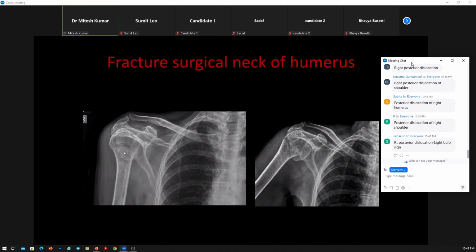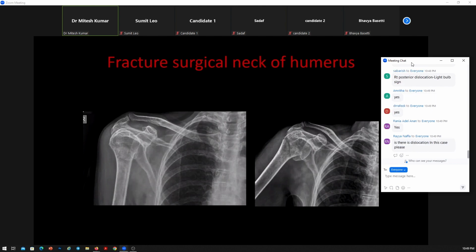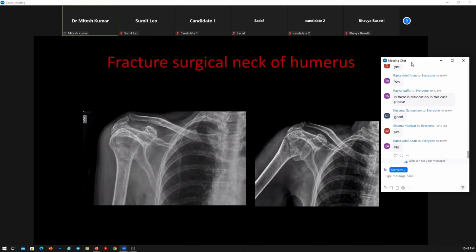I hope everyone is getting this X-ray. Hello? Yeah, I am here. I'm just waiting for the people to answer in the chat box, and most of them say yes. Yeah, true. Is there dislocation in this case? May or may not, I don't know.